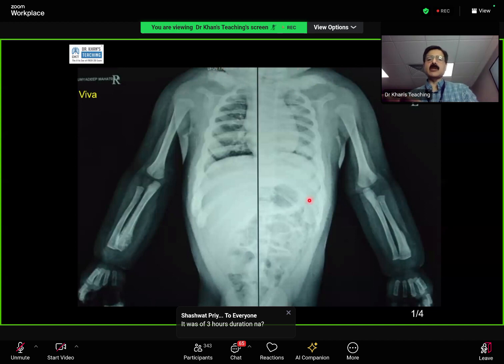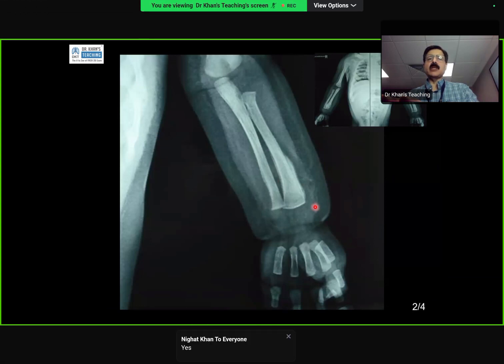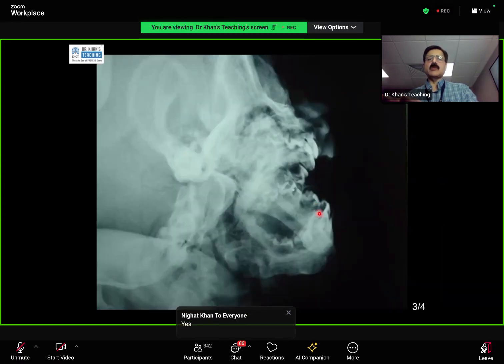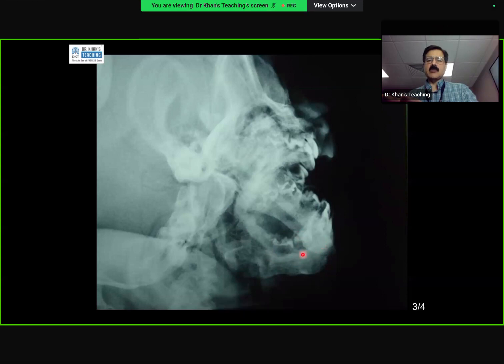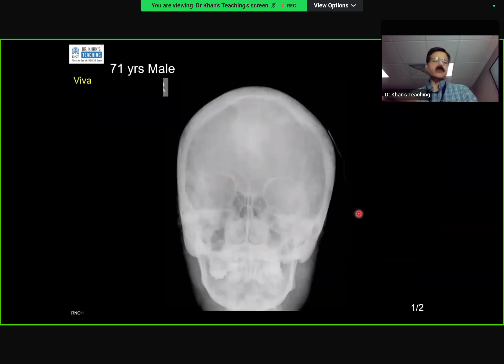You will tell the examiner, I want to see the mandible. If the examiner has got the mandible, they will show you. Look at this case. Now, these are the teeth. Actually, where I'm pointing is the mandible, and everything here is new bone formation. So a very, very thick mandible. So you have to ask for it from the examiner.